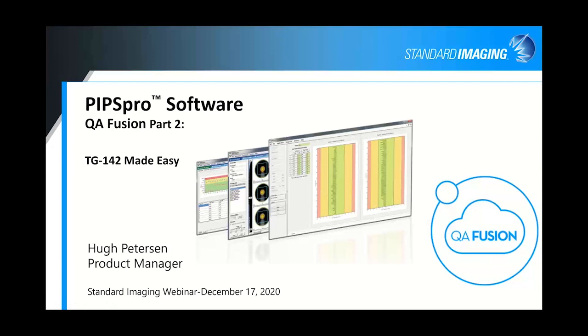So we like to call it TG142 Made Easy. It has components within a number of different modules to allow you to do many different tests for TG142, or just QA in general if you don't adhere to the AAPM task group but use your own protocols.